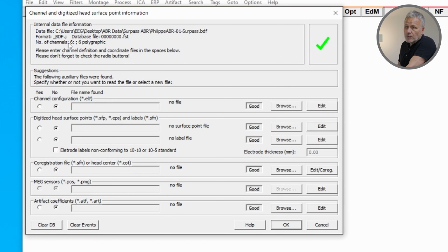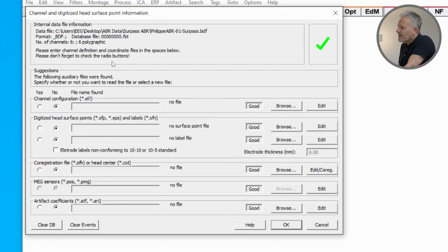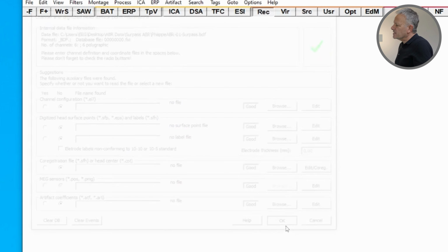The others are L-mon, ref, R-mon, left and right. There you also have the attached file points, etc. So all the stuff that belongs to that file is found here in the demographics.